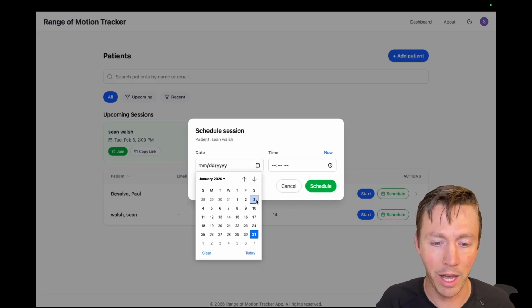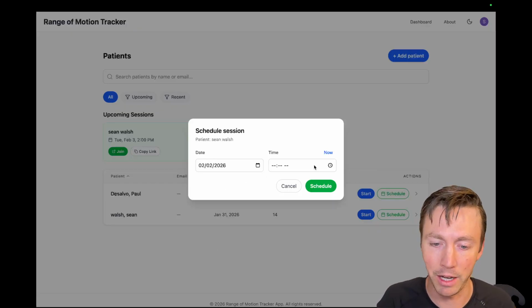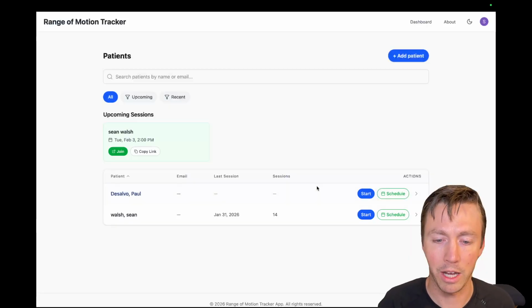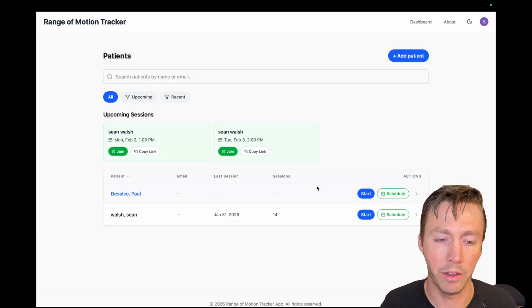So say I wanted to schedule myself for this upcoming Monday, and we'll say 1 o'clock, and we'll say PM. So I'm going to go ahead and schedule. So that schedule's right on there.